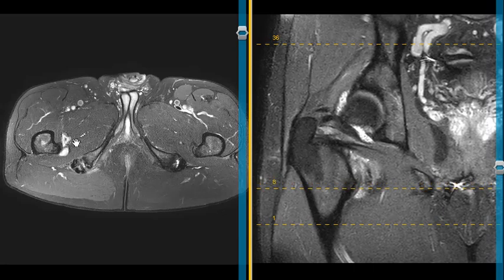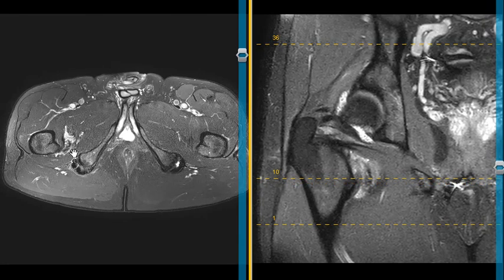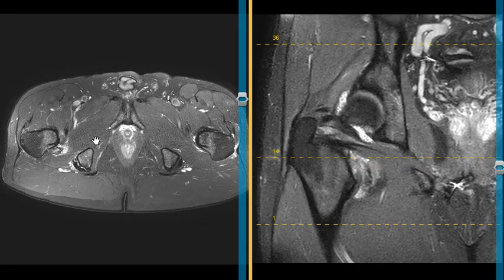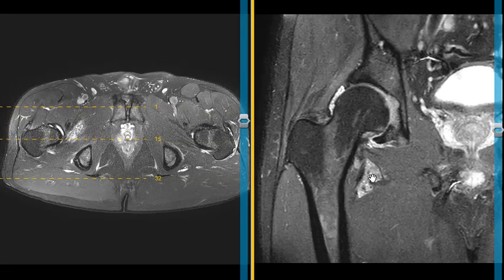So inflamed bursa, lesser trochanteric bursitis is a very rare cause of hip pain and buttock pain. We have a muscle here, the quadratus femoris muscle. Sometimes this can be pinched when this gets inflamed and irritated, but I do not see any muscle edema. And this can be related to gout or rheumatoid arthritis or psoriatic arthritis or overuse, prior injury, lots of different things. But again, a very rare thing of lesser trochanteric bursitis. Thank you very much.